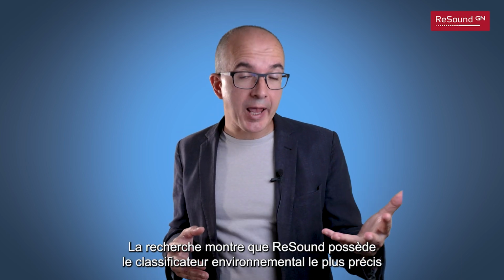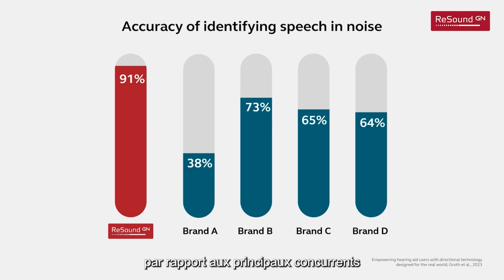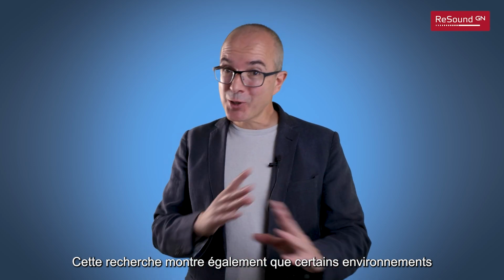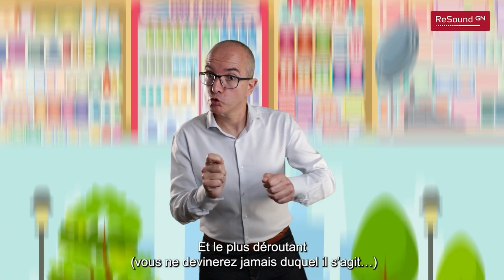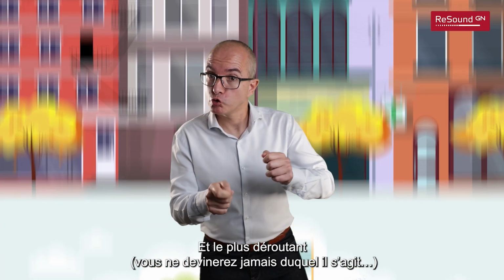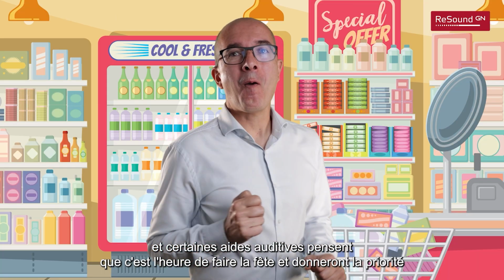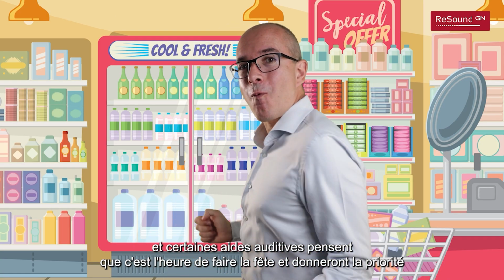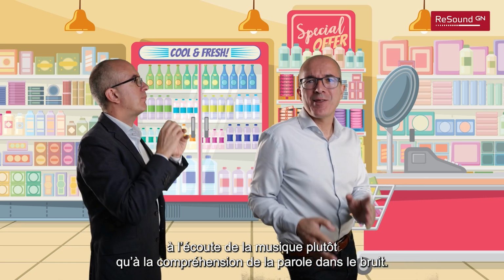Research shows that ReSound has the most accurate environmental classifier compared to top competitors, especially to identify speech in background noise. This research also shows that there are some environments that can be very confusing for hearing aids. And the most confusing one, you will never guess which one it is: supermarkets. This is because many supermarkets have background music, and some hearing aids think that it's party time and will prioritize music listening over speech understanding in noise.